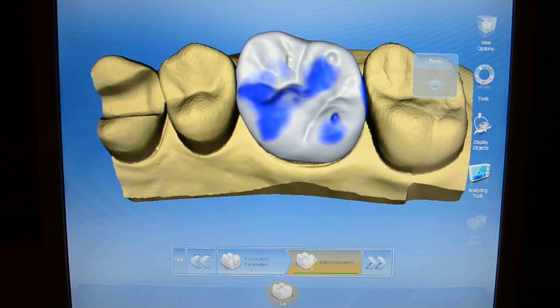I can trace it out more. And again, if I go too far, I'll do it on purpose here. I'm going to open up that kind of ocean blue color here, and it's letting me know I'm too thin, so I wouldn't want to do that. So let's add that back until that goes away. And now we're in good shape.